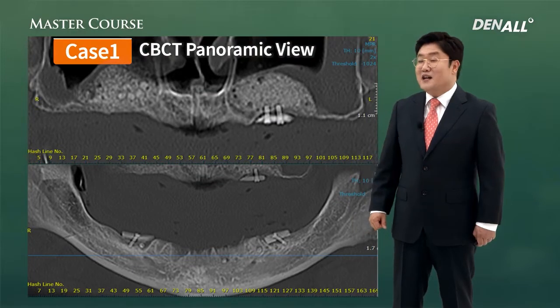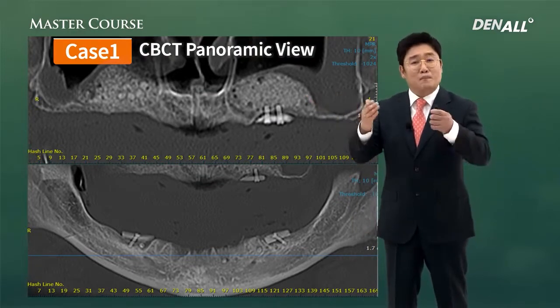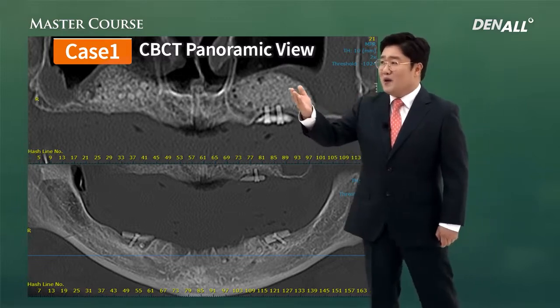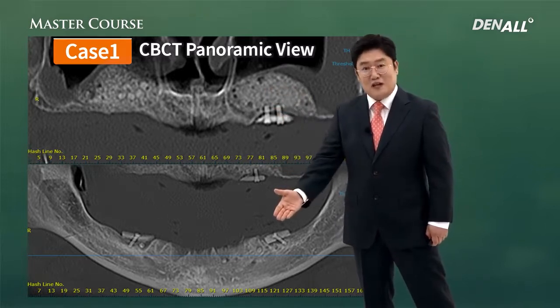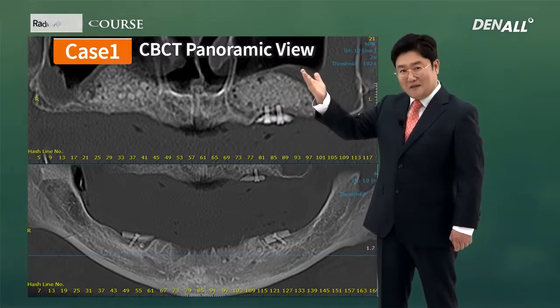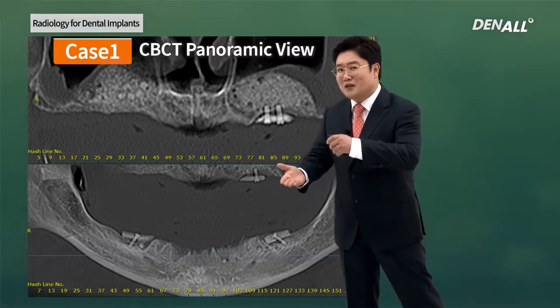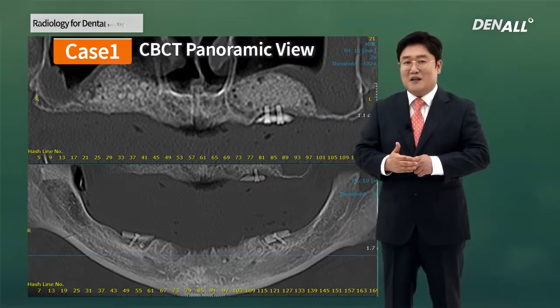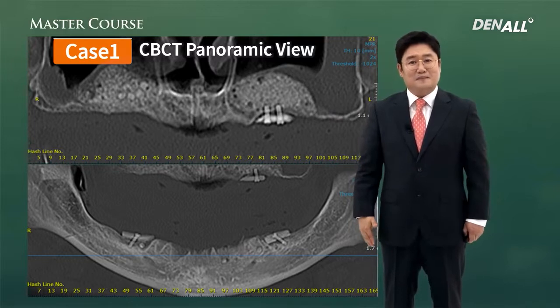Cone beam CT cuts have been recomposed for panoramic view. So the panorama view is made of CBCT cuts. The graft positions and amount can be checked. Important anatomical structures, the status of the sinus and inferior alveolar nerve, their location and relation with other structures can definitely be checked with the CBCT.